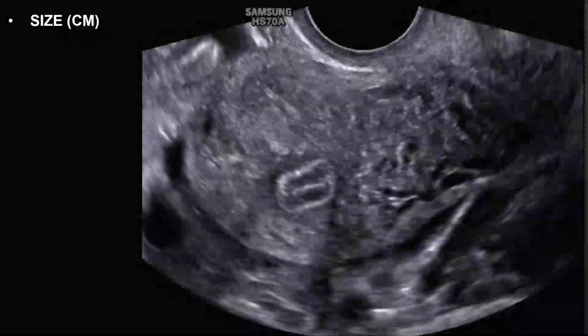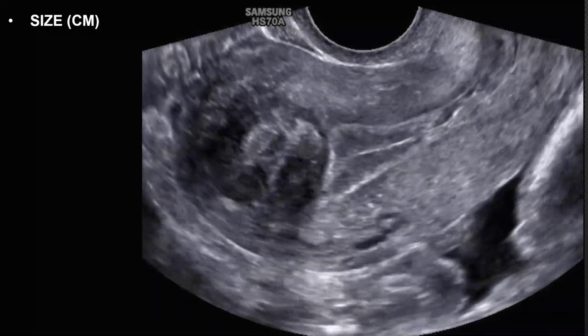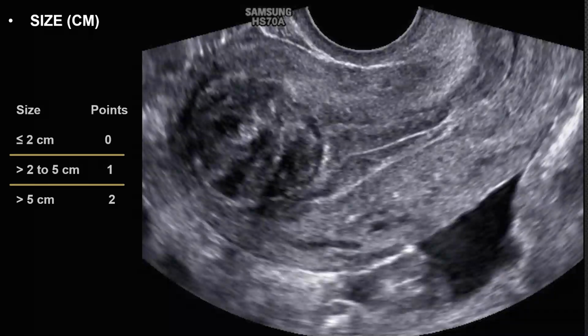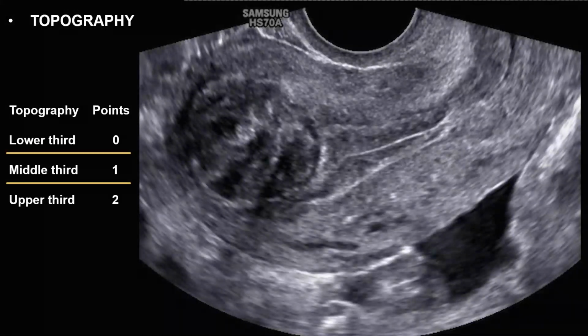Therefore, for the treatment of this submucosal fibroid, based on the step W classification, a low complexity hysteroscopic myomectomy is recommended. In this other case, applying the step W classification system, the largest diameters are between 2 and 5 centimeters, and a score of 1 point is given. In this same case presented, the fibroid is in the upper third, so it receives 2 points.